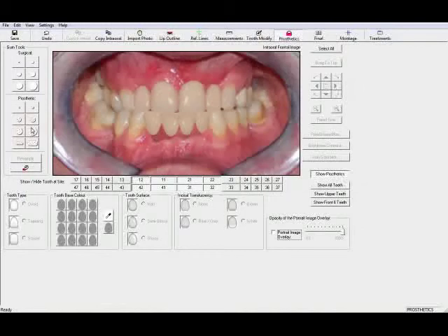Using the prosthetic gum tool, we can create here what will be the appearance if prosthetic filler is used to fill in the voids. This is not meant to be an Adobe Photoshop shoot where we can create something that we cannot do clinically. This is meant to be as realistic as possible.